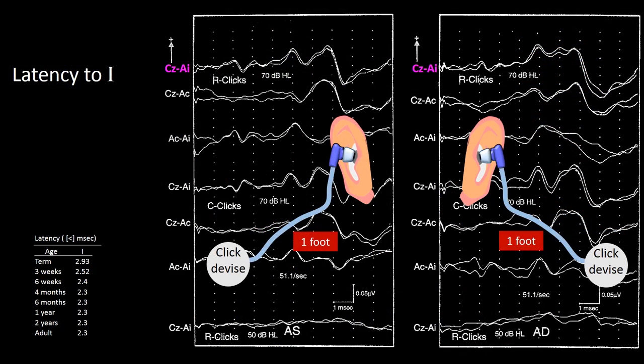As you can recall, this study was done using a special ear stimulus equipment that does not produce a stimulus artifact, but does produce an additional delay between the stimulus production and the arrival of the stimulus at the basilar membrane of the cochlea. This delay is about 0.9 milliseconds.